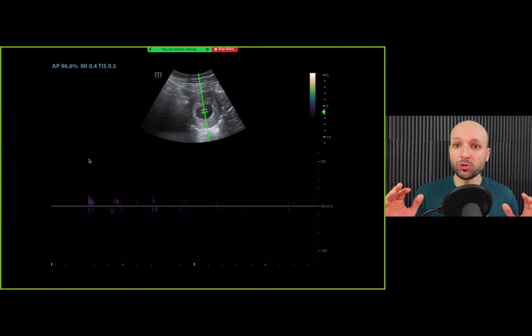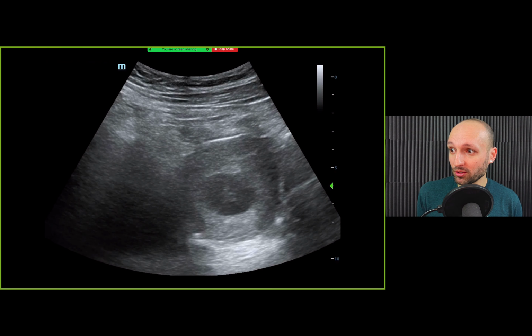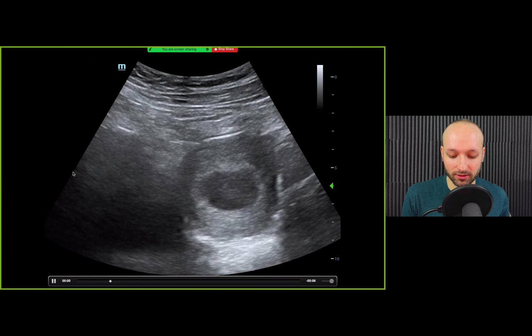You always want to use the lowest dose of whatever it is that you're using to get the effect that you want. M mode is exactly the same as B mode. It's just interpreting the data differently. So if I see a pulse wave Doppler, I cringe a little bit, because most of the time you can get the exact same data using less energy, and that is the M mode. So this is that image with less depth, and you can see a little bit better resolution.